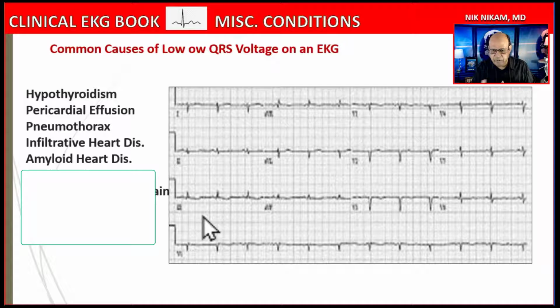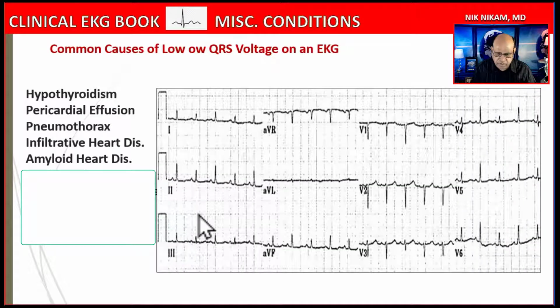Again, you have to remember that along with low voltage, we can see so many other things like U waves or ST-T changes or changes in the PR interval and the amplitude of the P wave, along with many other things. All right, now let's look at an EKG.